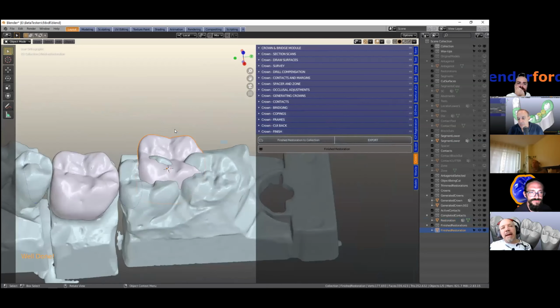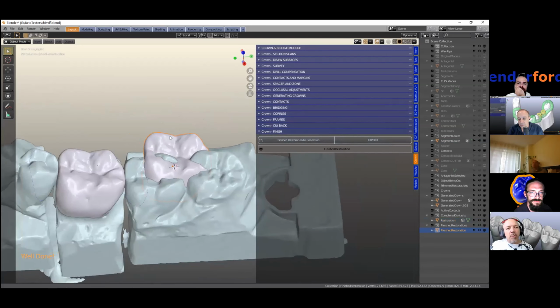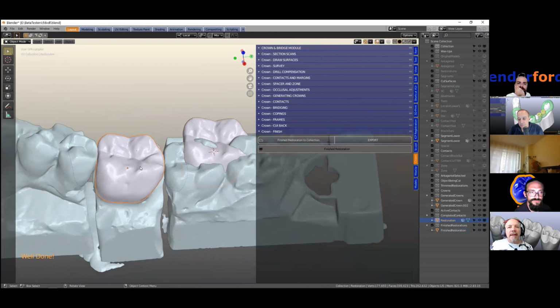I've experienced that if we export this straight away, then the point of origin is completely different when you're trying to nest it, and then you can't rotate it properly. That was my experience. Maybe you've got a different experience, but this is why I've put it in the center of Blender, and then we export it like this as usual.